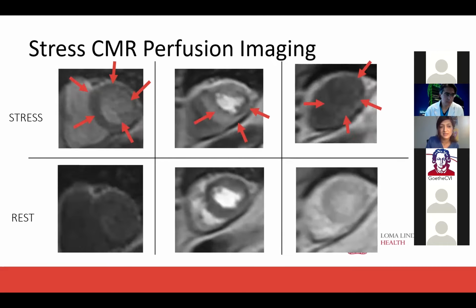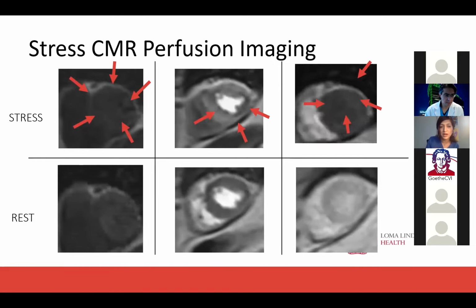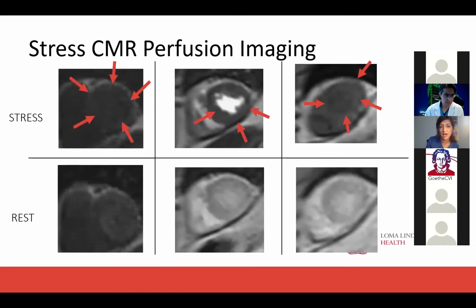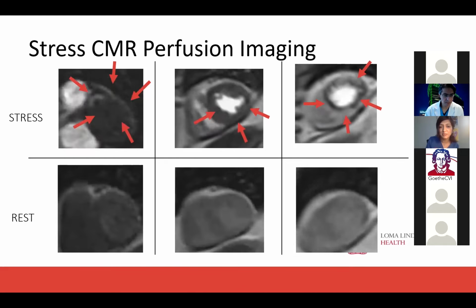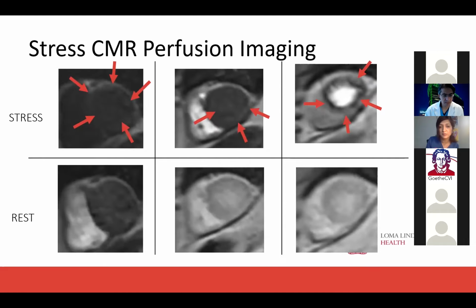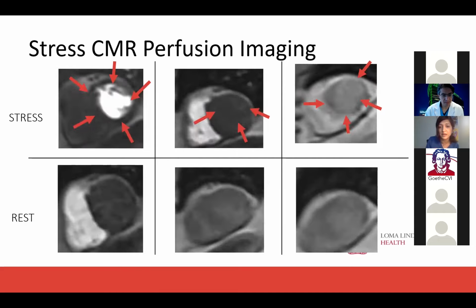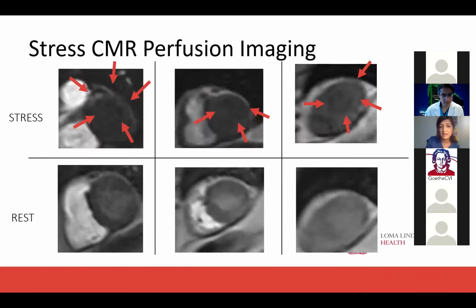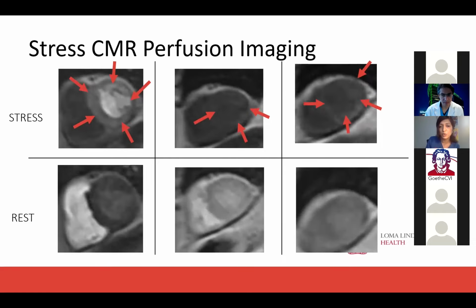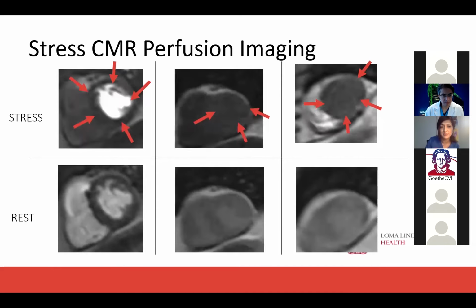So as we can see, there are multiple regions that are involved in this patient from basal, mid to apex, and compared to rest, it's quite an abnormal response. As Dr. Kramer suggested, the dark rim artifact typically would disappear within 6 RR intervals, while this defect stays throughout this perfusion. So next slide, please.